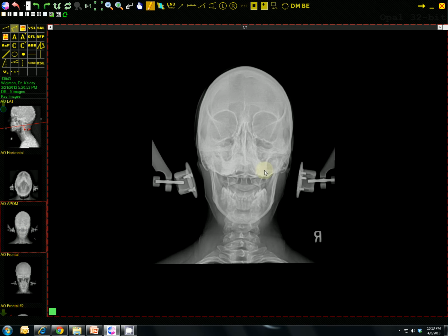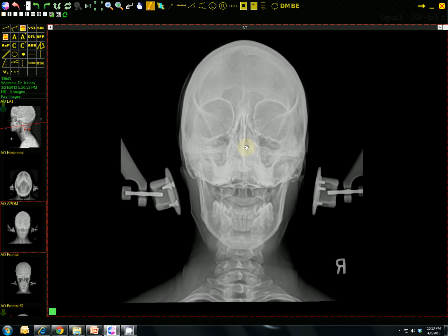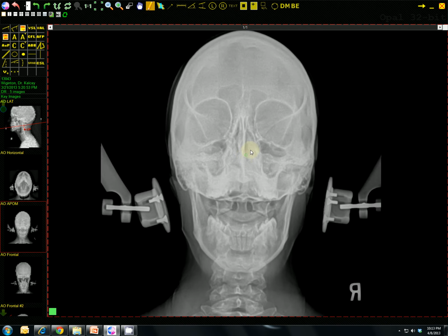Okay. So again, first thing that we want to do is obviously make sure that this is positioned correctly. So I'm going to zoom in and bring it down just a little bit and zoom in all the way. Obviously I want the bone enhancement to be up to 80, so it's a little bit clearer, and make sure that I can see my surfaces just fine.